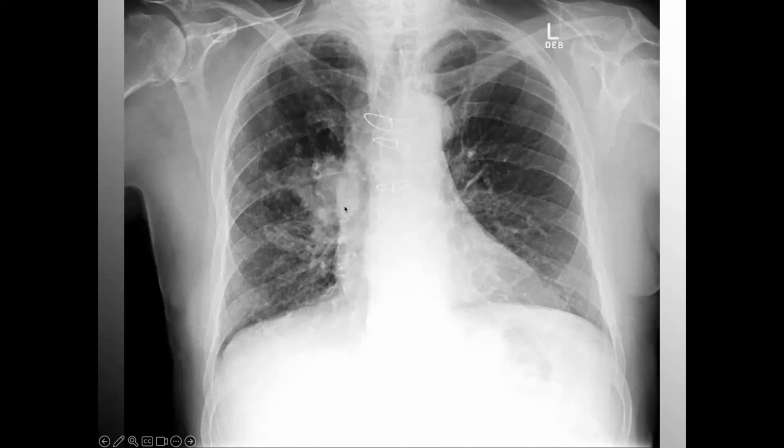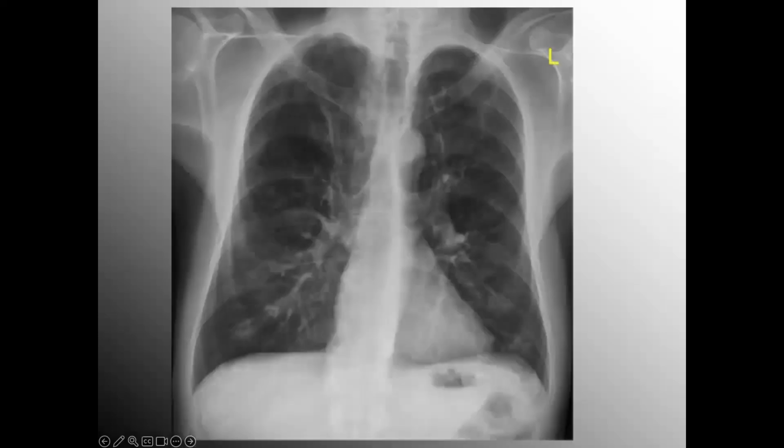So that tells me for this patient, it's a pretty significant abnormality. The patient could have had a CABG, again, with the sternotomy wires, but they've had a thoracotomy nonetheless. So you know there is some degree, most likely, of cardiovascular disease, or they've had some type of pathology requiring us to open the chest.